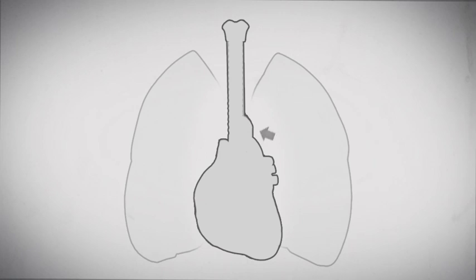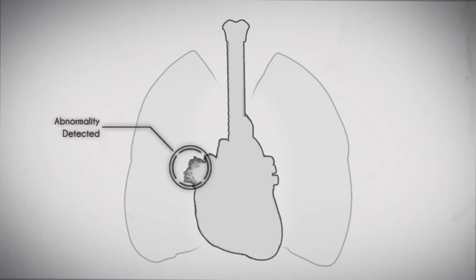Notice the large bump coming off the left side of the mediastinum, part of the classic silhouette border. However, if the bump had a different density to the rest of the mediastinum, or was not actually touching the mediastinal border, that bump would then become something of interest and need to be explained. Likewise, whenever something has the same density or attenuation as the mediastinum, and is touching the mediastinum, then one must rely on pattern recognition of the normal shape, size, and contours to detect the abnormality of the silhouette.